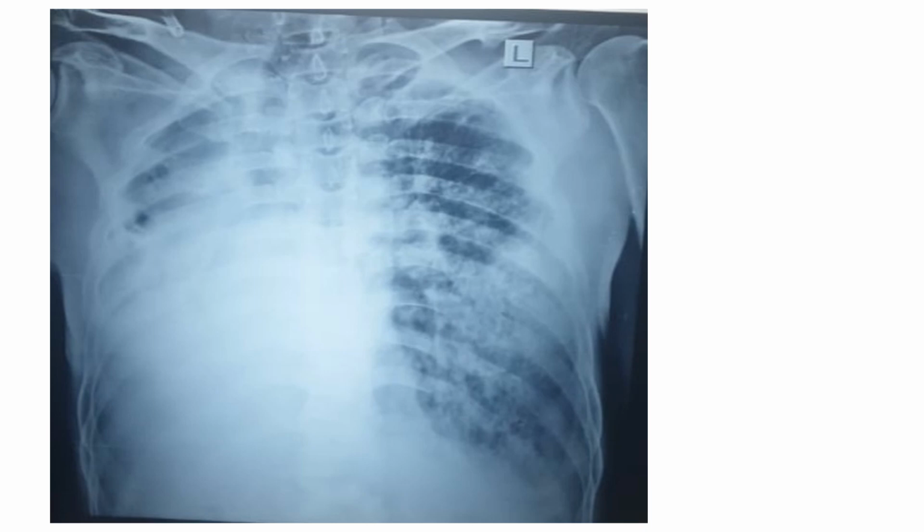Grossly you can see that the right lung volume is much smaller compared to the left lung. Right lung is smaller, and in the left lung there's fibrosis up here and all, but we'll ignore all these things and focus on the volume. So volume is less here, and here volume is quite large. Usually the cardiac shadow should be on the left side up here, right? This area should be occupied by the cardiac shadow. It is not there, so it has shifted to this side. So there is a mediastinal shift to the right side, and this is the trachea, right? The trachea is also shifted to the right side, so there is a right-sided volume loss.